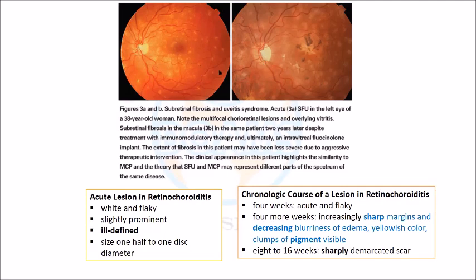Okay, this is choroiditis. So subsequently there will be optic disc change also, right? If any disease involves the disc and the retina, like sarcoidosis, tuberculosis, the granulomatous diseases, they can involve the disc. Again, there will be optic atrophy. Again, asking you, what will be the diagnosis of that optic atrophy? If retinal disease causes optic atrophy, is it primary, secondary, or consecutive? It will be consecutive optic atrophy. If the disease process involves the retina, usually it involves the disc because the retina and the choroid are close together. So this will be consecutive optic atrophy.